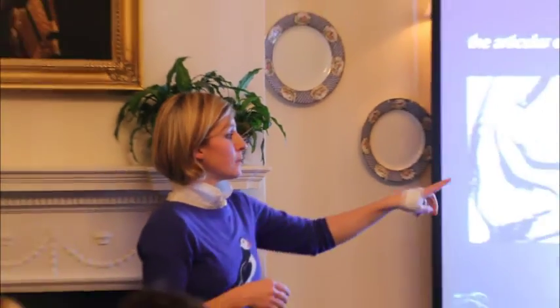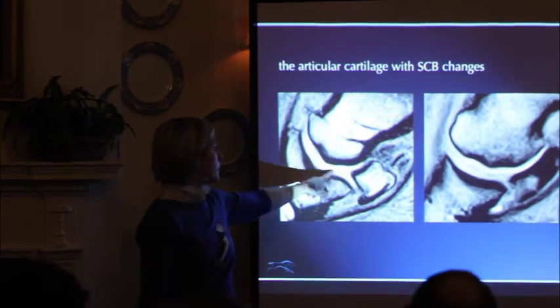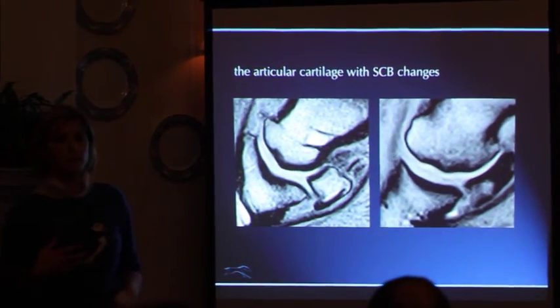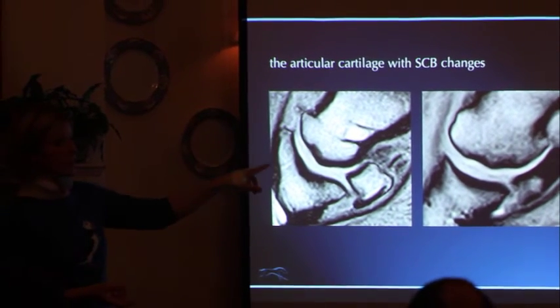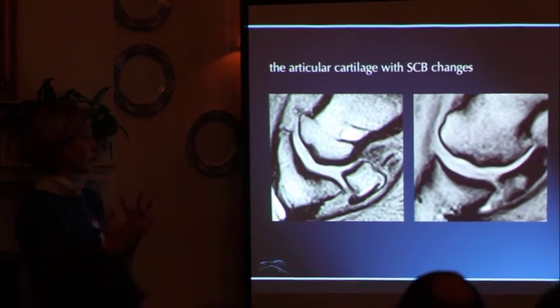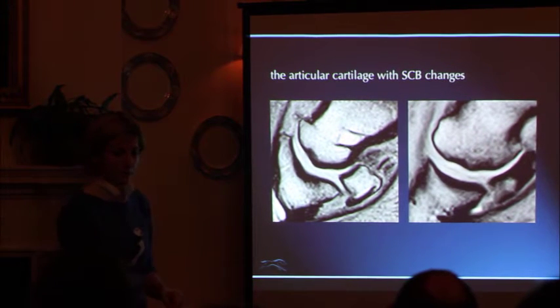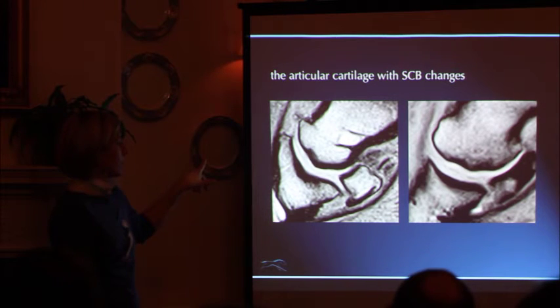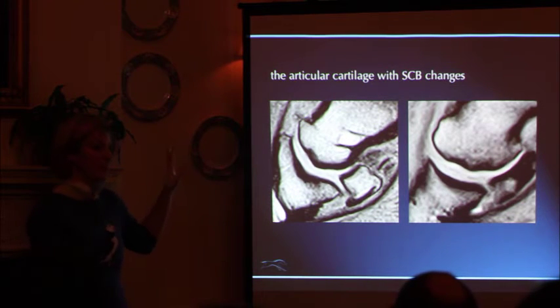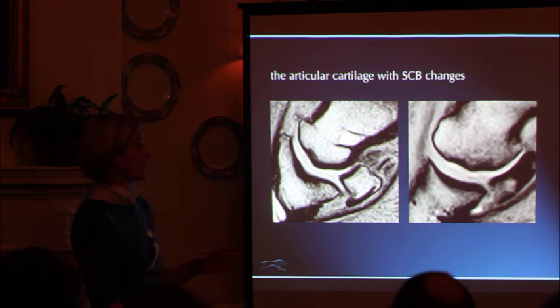It gets much easier when we've got subchondral bone changes, and these are quite common. This is quite a common appearance in horses with more advanced osteoarthritis of the coffin joint. You get the condyles remodelling because they're pathologic and they're changing shape, and this can tell us quite nicely that there are problems developing there. Now you will see cartilage disease of some form in almost every horse that you MRI scan, and that's why it becomes very important to decide what's relevant and what isn't.